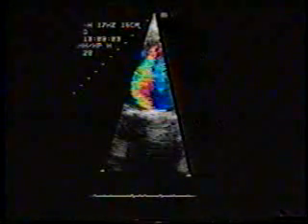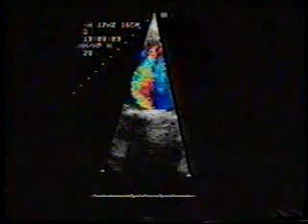In this apex up 4-chamber view, you see the usual reverberations from the mitral disc in the left atrium. In real time, you will see that the disc motion appears reduced. Color flow imaging also suggested stenosis of the mitral prosthesis, because the diastolic jet was narrow at its origin and quite eccentric.